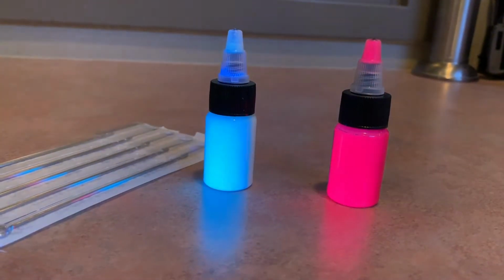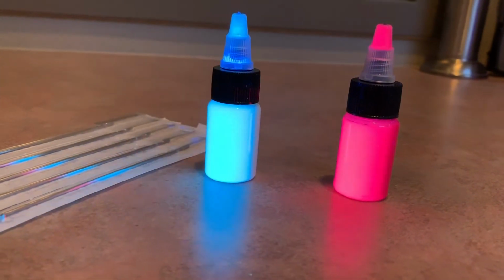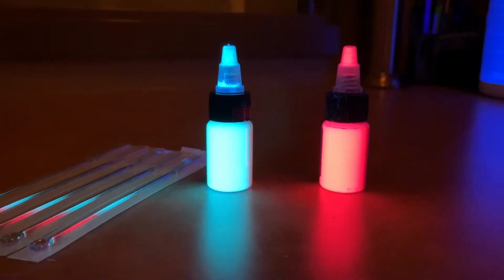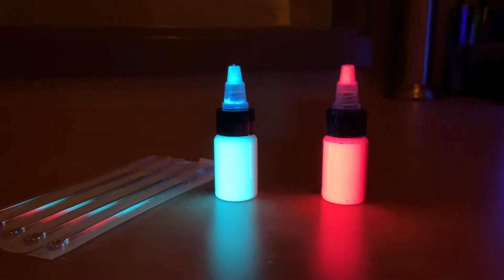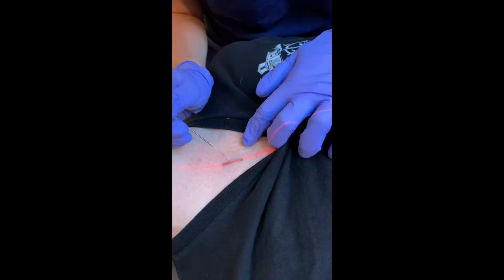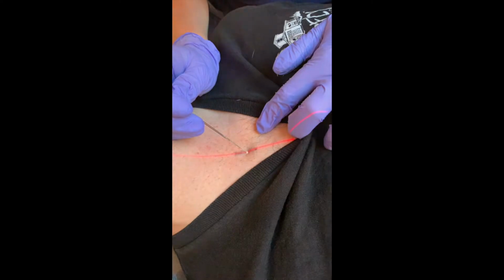There's another type of tattoo that may be used, which is an ultraviolet tattoo. This is permanent just like the standard one. However, it will shine when using a special ultraviolet light. This allows the therapist to find the tattoo and align to it. One difference, however, is this type of tattoo may be completely invisible to the eye under normal light and only be seen with UV light.